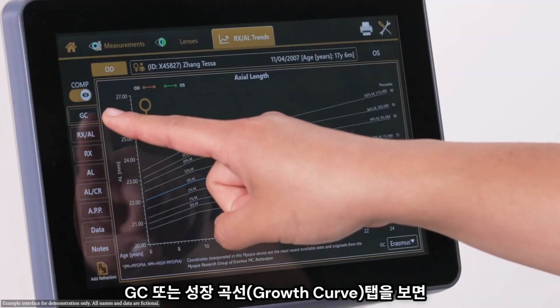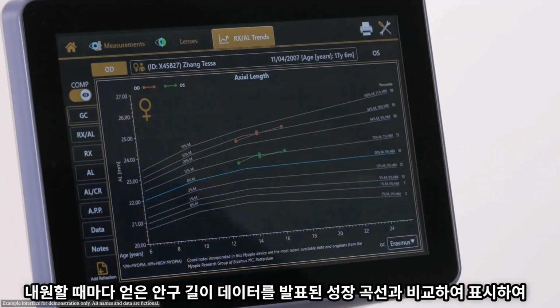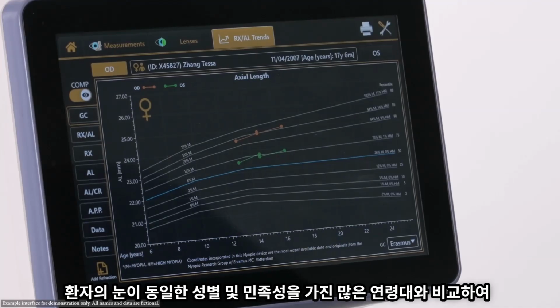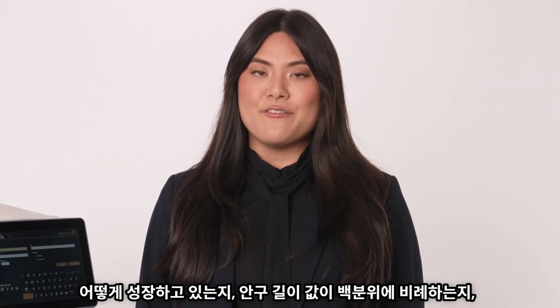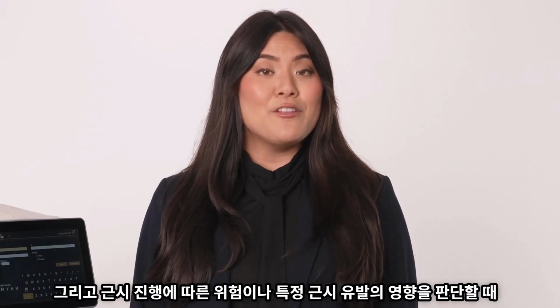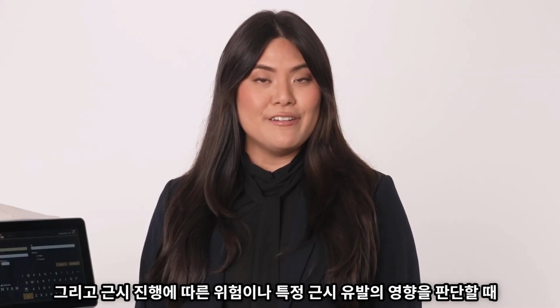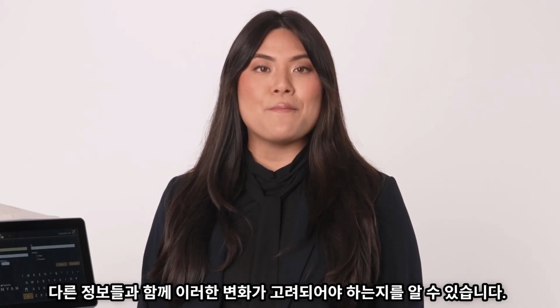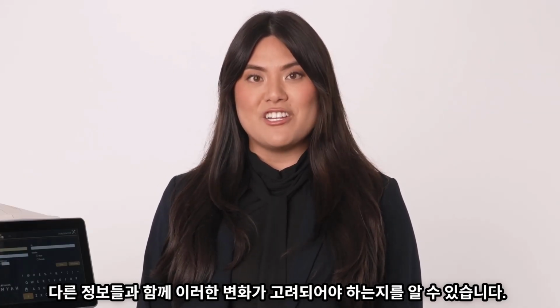The GC, or Growth Curves tab, plots the axial length at each visit against published growth curves, enabling you to see how the patient's eye is growing in relation to a large age-matched population of the same gender and ethnicity. Where the axial length values sit in relation to the percentiles and how this changes over time should be considered alongside other information when judging the risk of myopia progression or the effectiveness of a particular myopia intervention.